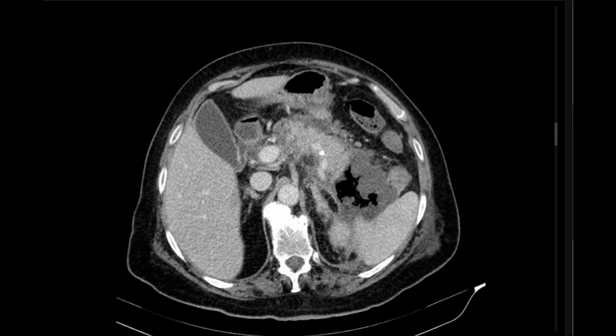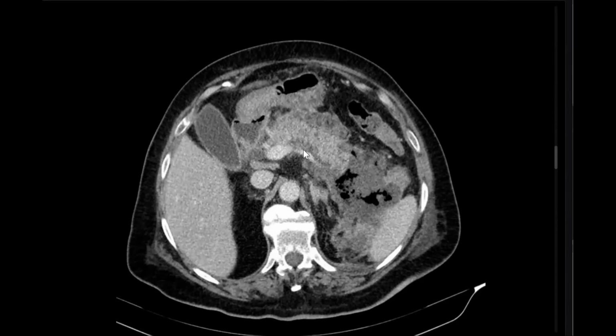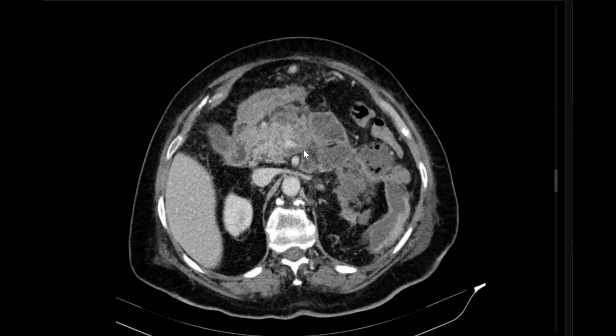It could be an aneurysm. No. It's calcific. It could be hemorrhagic. Okay, yes, it is calcific. Okay. Calcific. It means we have previous attacks. It may represent chronic pancreatitis. Very good, very good. Okay.